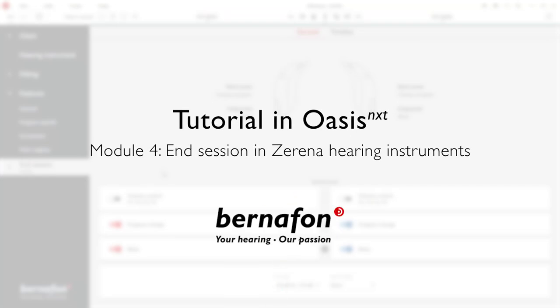My name's Jody. Today I'll go through a section of OasisNXT. OasisNXT is the latest fitting software from Bernafon, and you'll need to use it when programming Zerena hearing instruments. As we go through the demonstration, you'll notice that OasisNXT has a brand new, fresher and more modern look about it, and the fitting flow is really streamlined. I'm going to access OasisNXT through the standalone version. However, if you want to, you can also access it through NOAH.